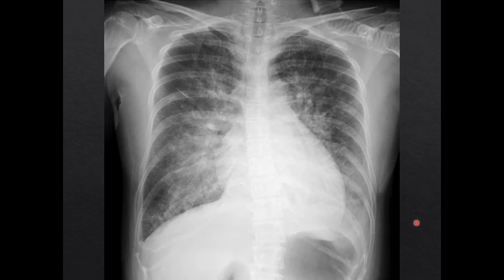Pulmonary edema can also be seen outside the Kerley B lines, here in the form of blunting of the costophrenic angles. Probably the biggest tip-off, though, of a cardiac etiology is cardiomegaly, an enlarged heart. This particular image is of a patient in her third trimester presenting with peripartum cardiomyopathy, a clinical sign of which you can't afford to miss being pink frothy sputum.